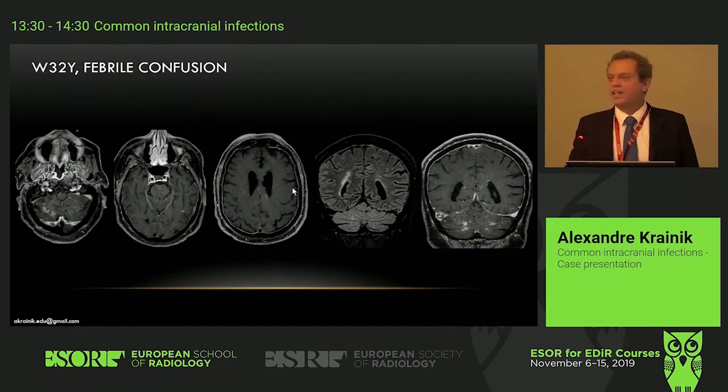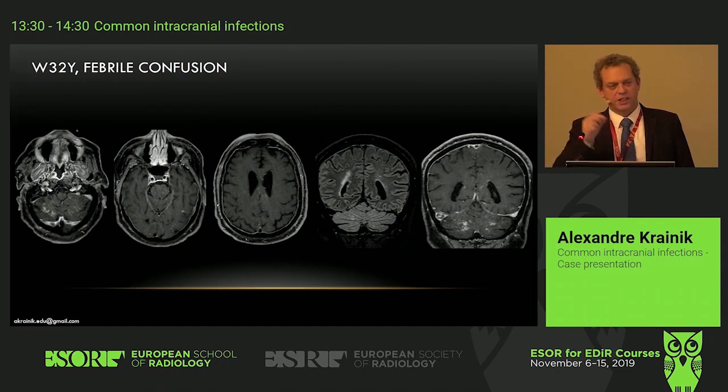Just like this, is there any ideas? Then first, do you see any abnormalities? Yeah, abnormalities here. You see little foci of contrast enhancement within the sulci, maybe also into the brain itself. Okay, at least a leptomeningitis, maybe rather patchy. Also a dural enhancement, when it's continuous, it's not normal. Normally the dura may enhance, but usually it's a discontinuous enhancement.